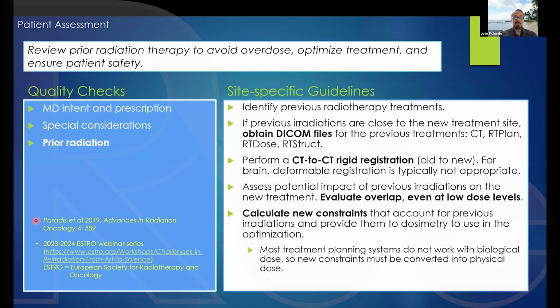Now, I don't remember ever seeing a case where I had to use deformable registration, but I can imagine that it is possible. So that's the reason I mention it. But I've always used rigid for most cases. And even in cases like the one I just described, you may still be able to do just a rigid registration, understanding that you're only focusing on a specific area of the brain that has not changed, and ignoring the part that looks very different.